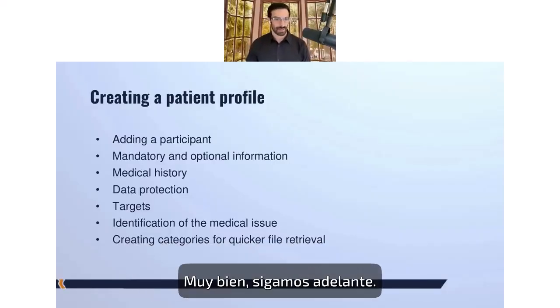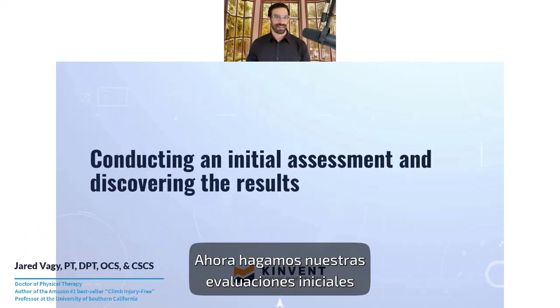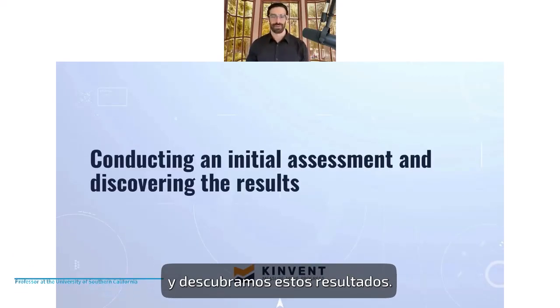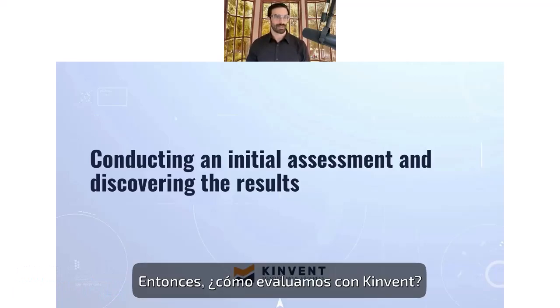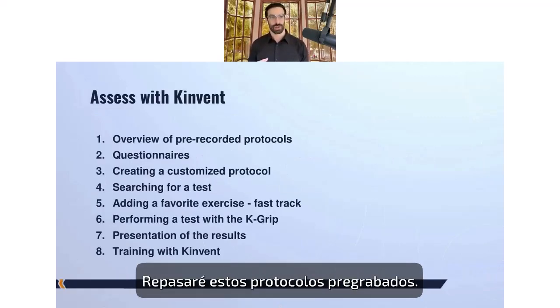All right, moving on. So we created our patient profile. Now let's do our initial assessments and discover these results. So how do we assess with Kinvent? Well, I'll go over these pre-recorded protocols.